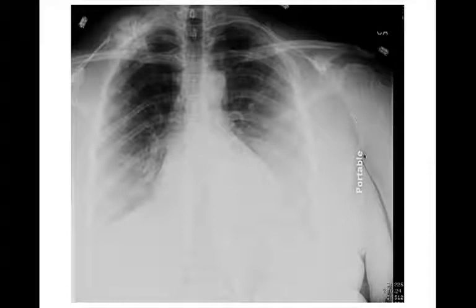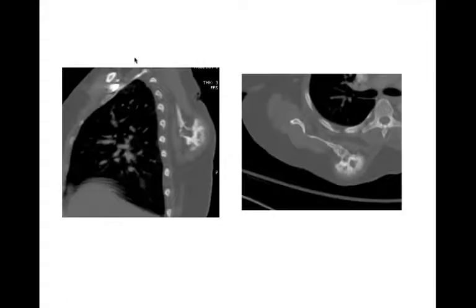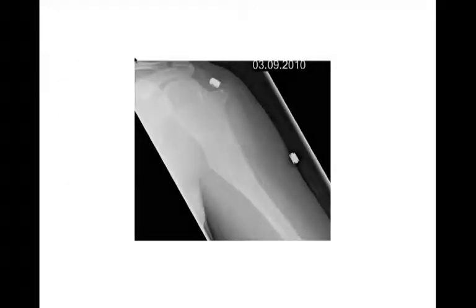This was another osteochondroma. This is a sessile osteochondroma of the proximal humerus. So if you saw this, because this is clearly an osteochondroma, you should be able to look at this and say this is probably part of an osteochondroma as well. So multiple osteochondromas again. Here's just another view of the humerus. So not only did they have one here, they also had one coming off on the lateral aspect of the proximal humerus.